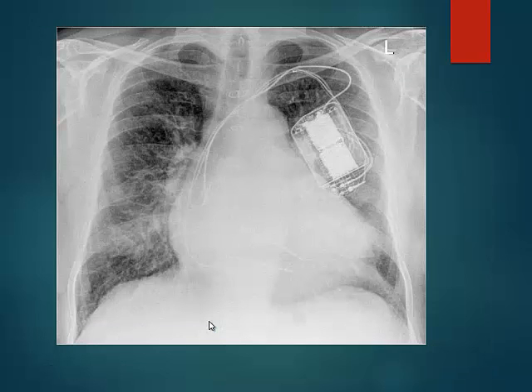And this is a patient. This is an old film I have, with a device that is an ICD. You can see a thick sheath here on the ventricular side, a ventricular lead, and it's an ICD. But again, on this X-ray, this patient also has chronic pulmonary vascular congestion. But there's some other finding here which I just want to point out.